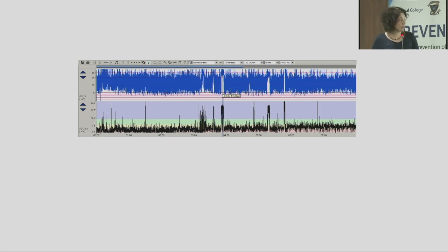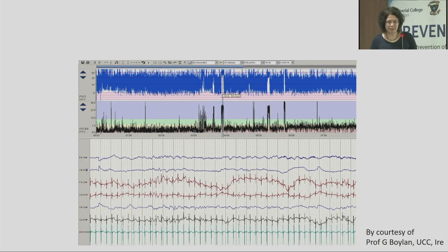Another problem is here. So here you have the aEEG. Background activity is discontinuous, and here seizures. Yeah, everybody would be happy to call this a seizure. Sudden seizure. So if you look at the EEG at that time, there's no seizure.